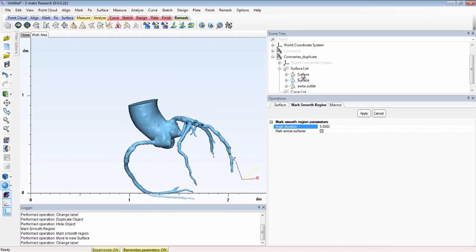All surfaces that appear in the scene tree are written as surface sets in the mesh file during export. Hence, you can use this feature to already identify boundary regions for conducting your simulations later on.